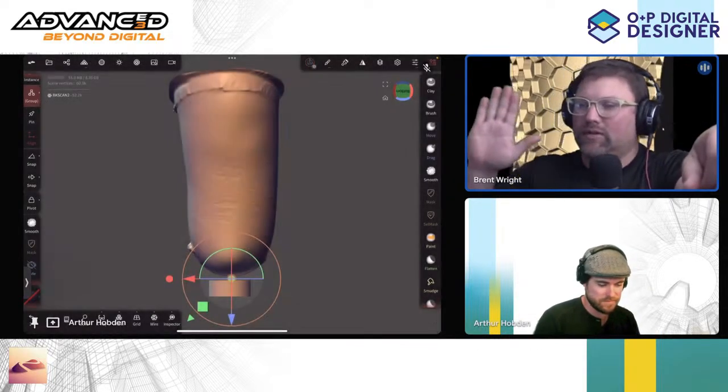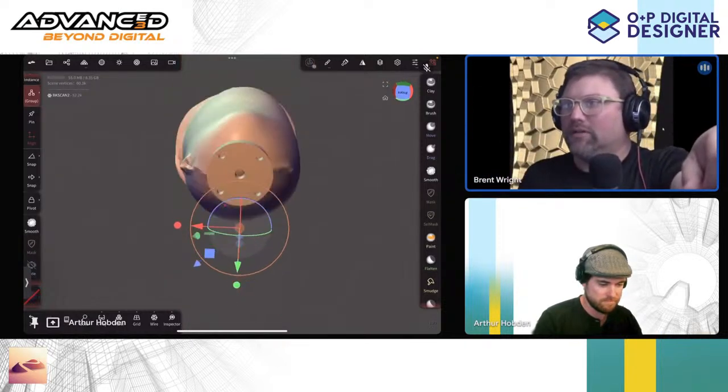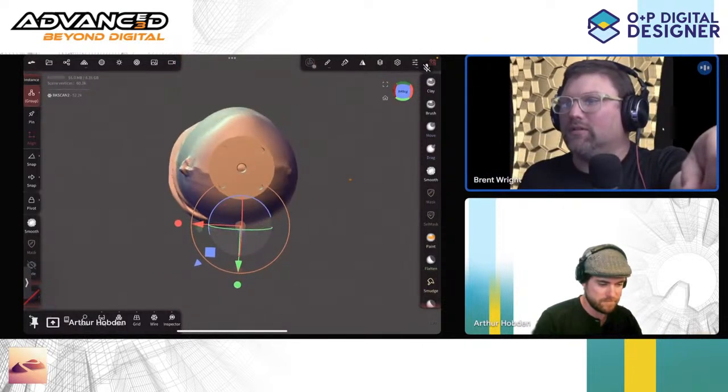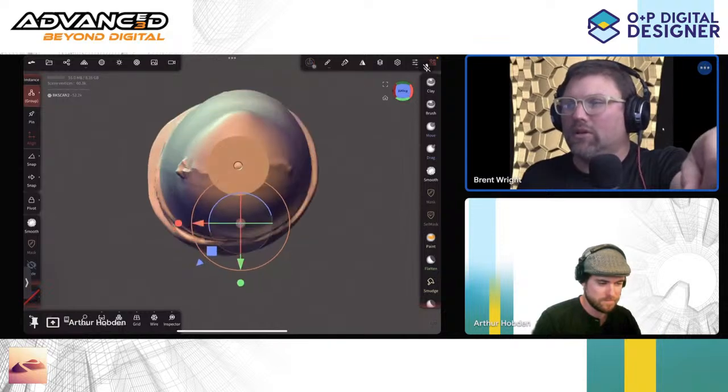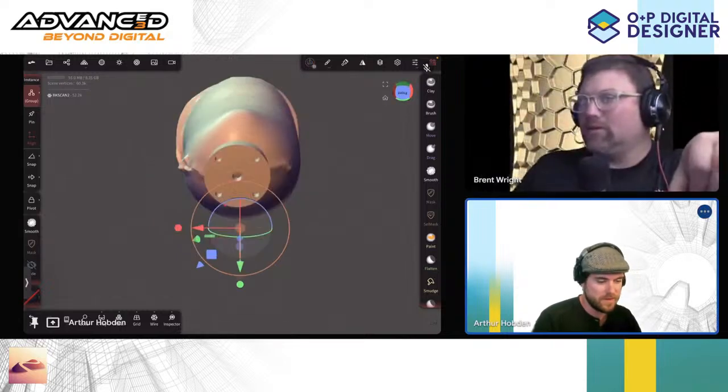Look at it from the distal end, kind of looking up. There you go. That allows you to take a look at the distal end of the tibia, and also how the patella is lined up to that. I think that's fine. Okay, great. Good to know.